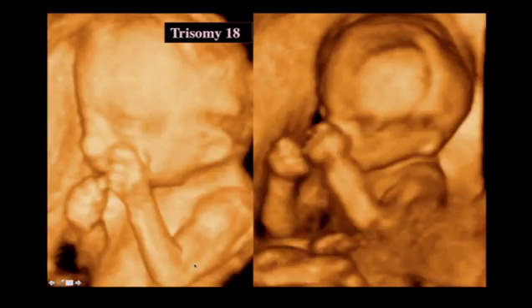So let's look at some examples here. You have trisomy 18, and this is a fetus with trisomy 18 with the typical clenched hand with overlapping index finger, like a little knuckle that is over the top of the other fingers, and you can see right here. And if you see this fetus, you would want to look for intracranial abnormalities associated with trisomy 18, such as a Dandy-Walker abnormality, choroid plexus cyst. They typically have heart defects. They may have omphalocele. They may have club foot or rocker bottom feet. They may have neural tube defects. They have a lot of abnormalities, including IUGR as well.